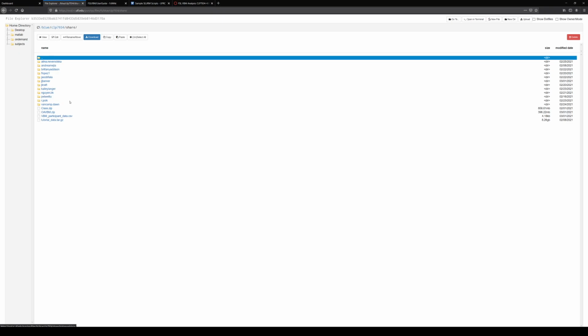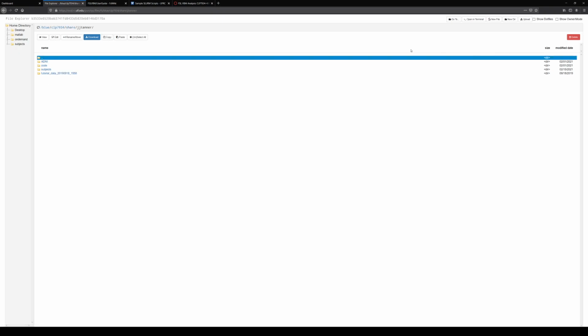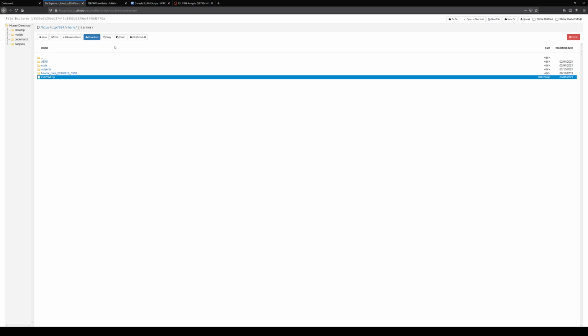Then I go into share, and now there is a file called oavbm.zip. So copy that into your subdirectory. And so I'll copy and paste. Again, you can also do this on the command line. And now we need to extract it. So I'm going to open in terminal.